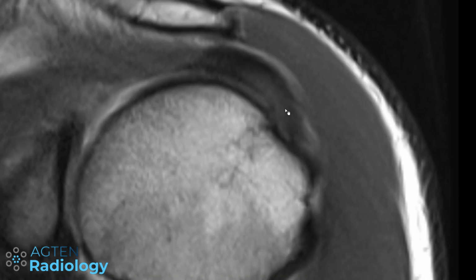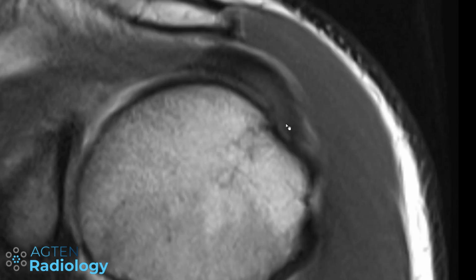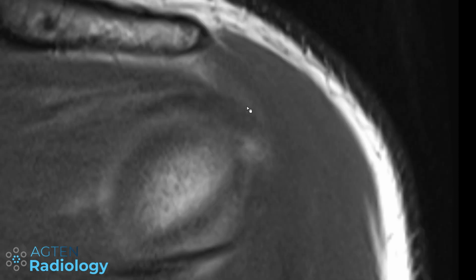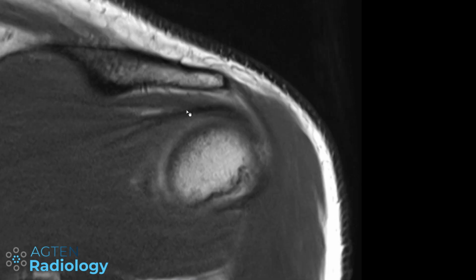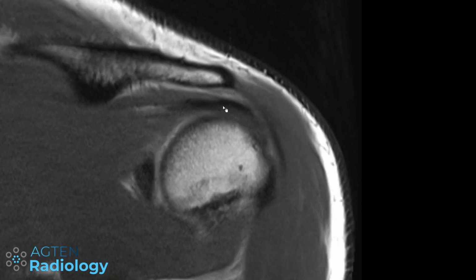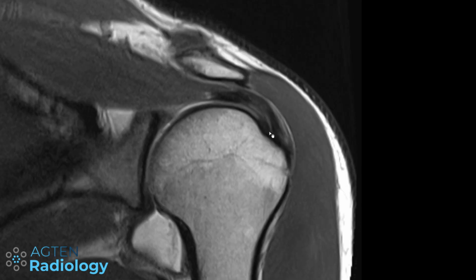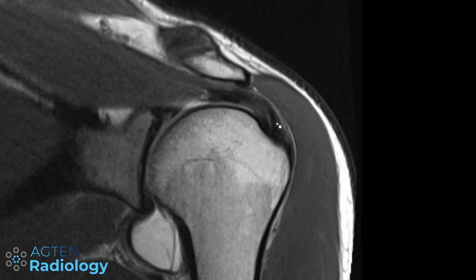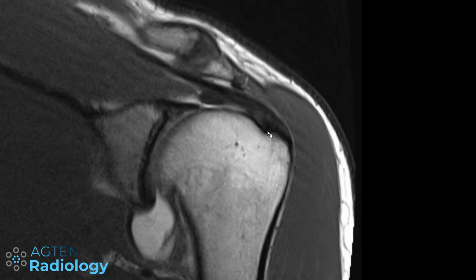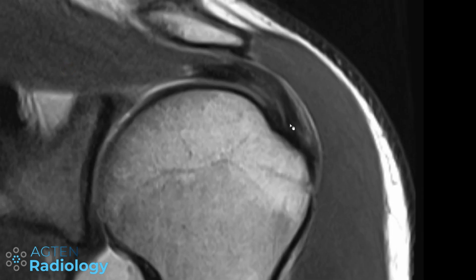What that actually is, is a slight overlap between the infraspinatus tendon and the supraspinatus tendon. So this is now posteriorly, and you can appreciate the infraspinatus tendon slips coming here. This is still infraspinatus tendon, and they are overlapping here with a portion of the supraspinatus tendon, and this is just supraspinatus tendon. And this is infraspinatus and this is supraspinatus. So we have a slight overlap, and these signal changes in between should not be called tendinopathy.